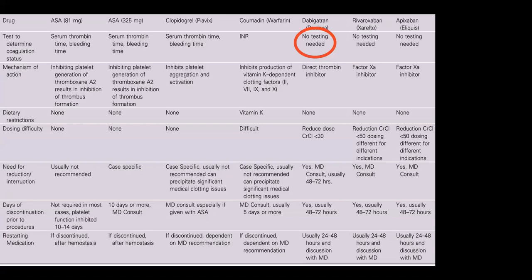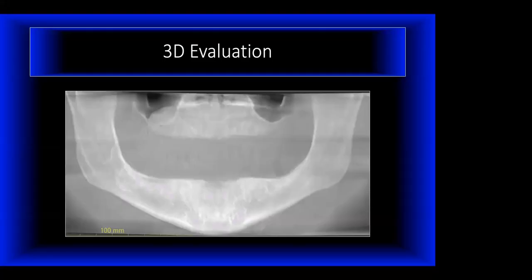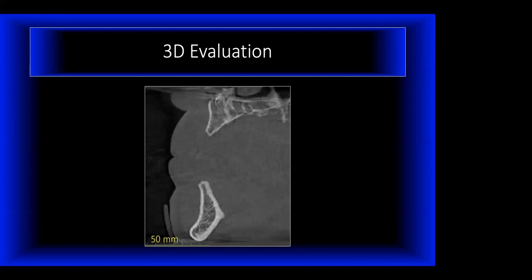So make sure you do an MD consult in writing on this and let them alter the patient's medication. So let's look at a 3D image of this. So here is the lower jaw. You can see a lot of bone.